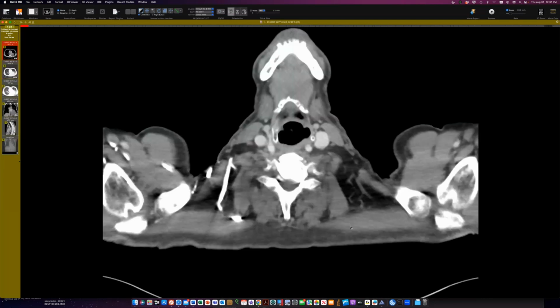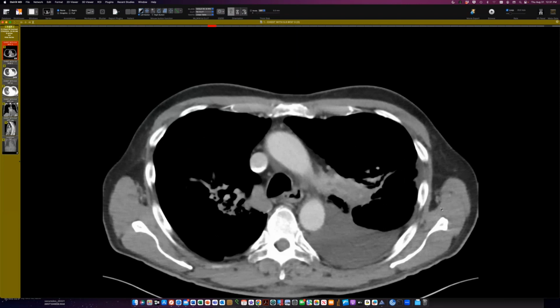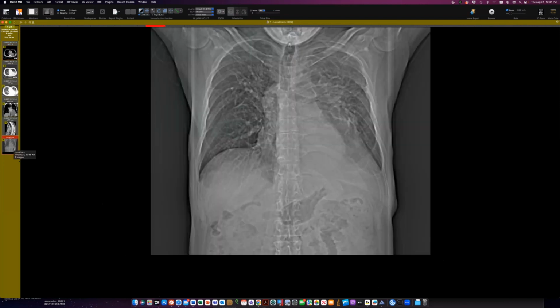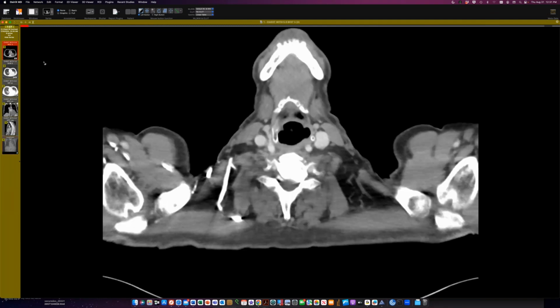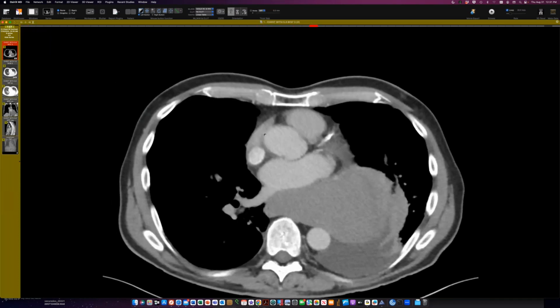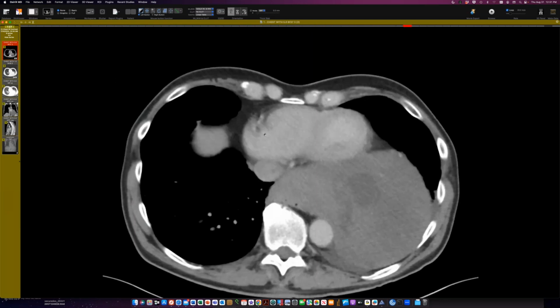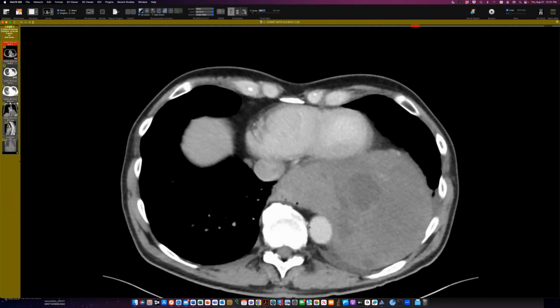And this person also has a lesion in the left base with a pleural effusion as part of it. Let me show you the scout view first of all. You can see there's quite a bit of stuff in this left lower lung down here, or left lower thorax, some pleural effusion as well. So on CT cross sections, we come down, there's some mediastinal calcifications, likely from histo or something, and then there's this big mass down here, really big mass, inhomogeneous, accompanying pleural effusion.